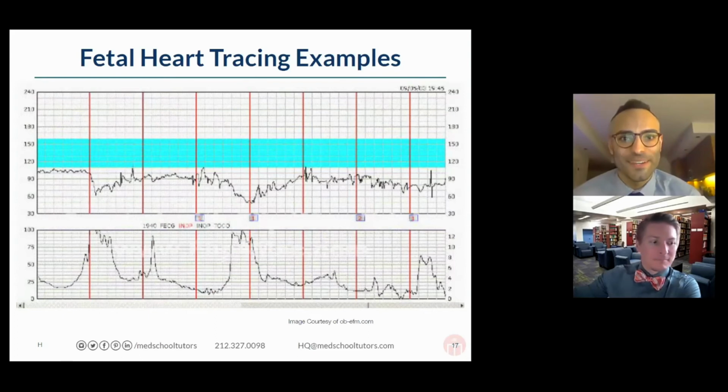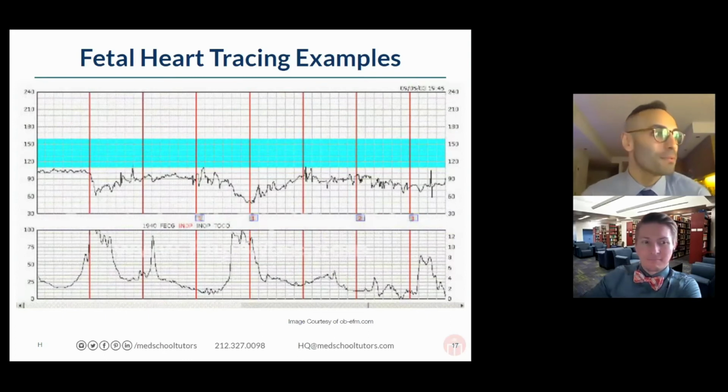Excellent, Wayne Broth, excellent. Bradycardia. Matthew, so, bradycardia. Good. Excellent. So I have some people saying cord compression already. Excellent. So that's correct. So this is fetal bradycardia, and you could see that below that highlighted segment of the normal heart rate, and that's not going to be there obviously on the real exam, but you could see that it's well below it. Okay.